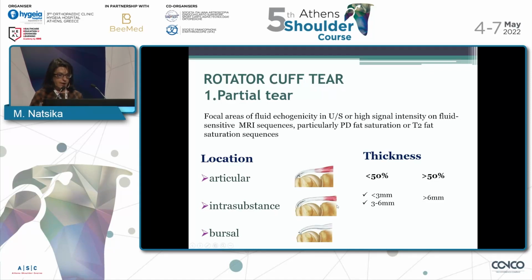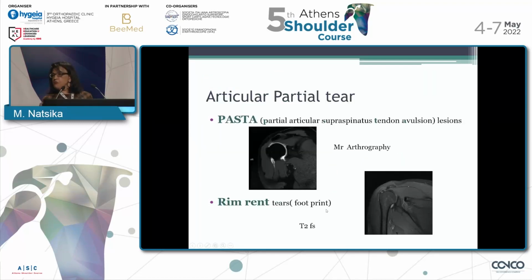articular. The mouse, I think it's a little bit problematic. Articular, intrasubstance, and bursal. It doesn't move very well.